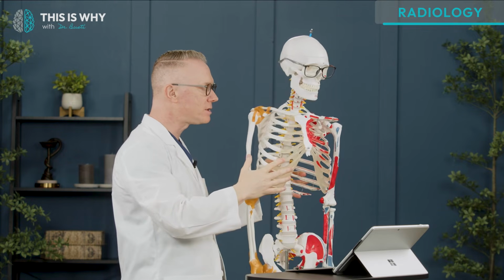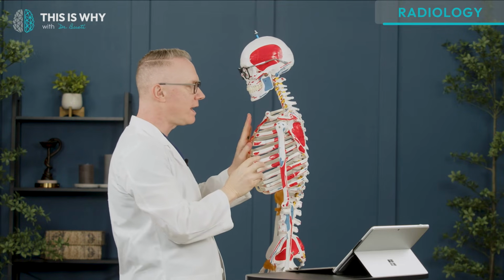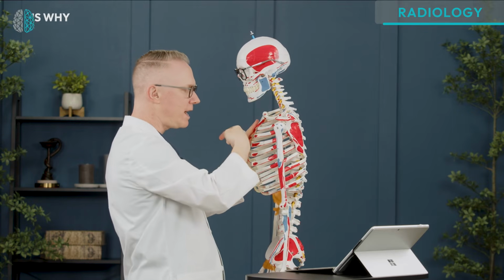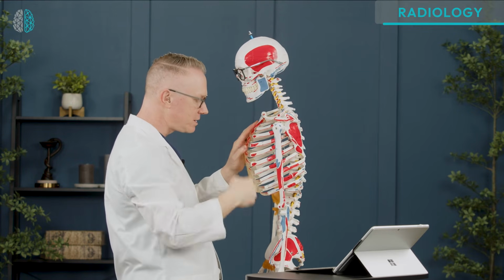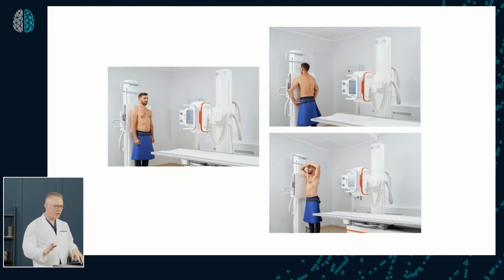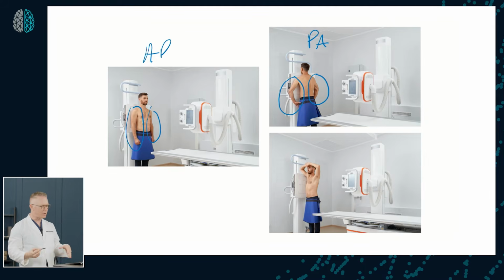And that's where a patient now is facing the detector this way, and the x-ray beams are coming in from the posterior to the anterior view, okay? Let's take a look at what that looks like here. Thanks, Bro. So you can see on this image here, again, we have our AP view here, but this is a PA view. And you can see that the patient's arms are in a different position than what you would normally see when someone's laying in bed.